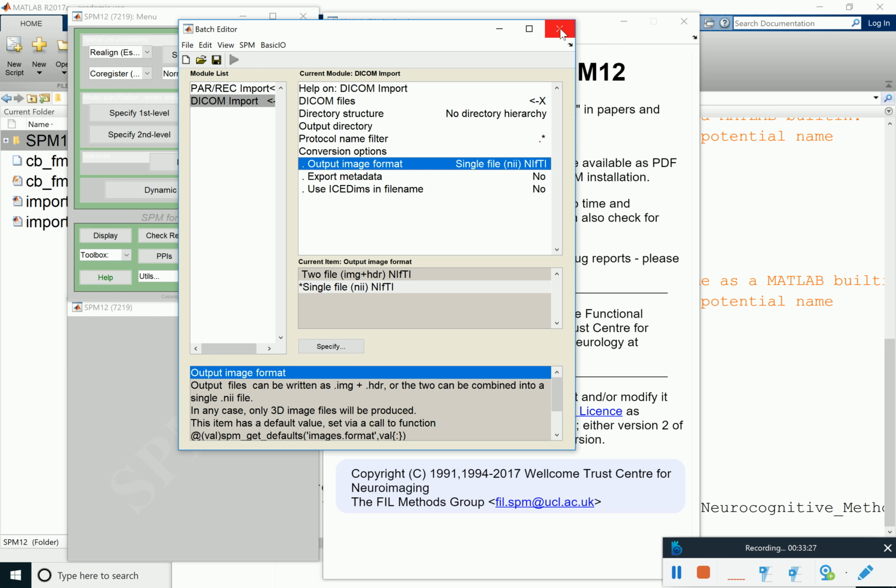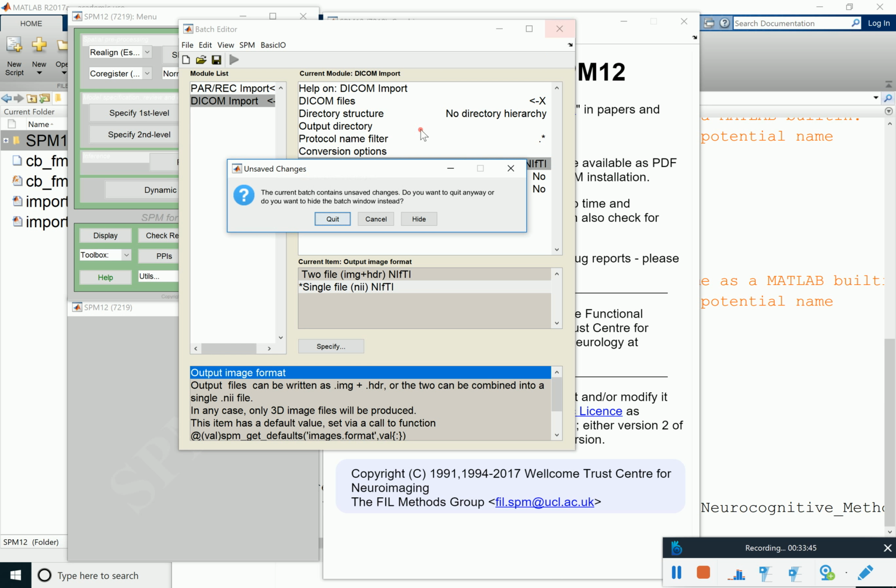On the other hand, you always see how many volumes you have, and you can do things like, we have to throw away the first 3 volumes because our Siemens scanner does some dummy scans, and we are not quite sure whether it's actually 3 or 2. You can do these things manually then. Here we don't have to throw anything away because as bad as Philips scanners are, this confusion they don't put on you.